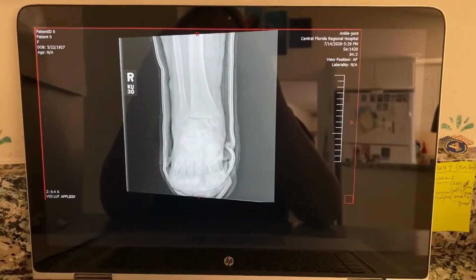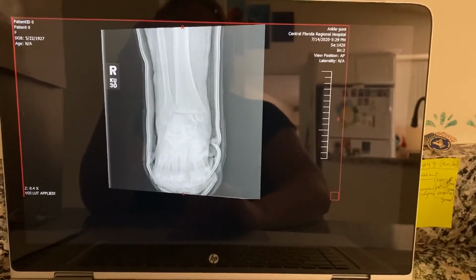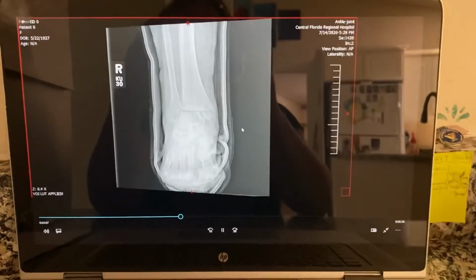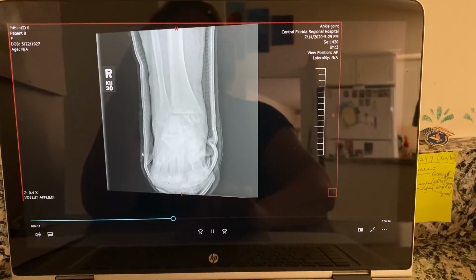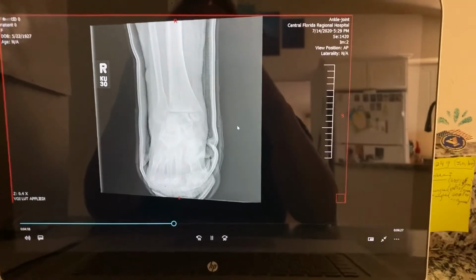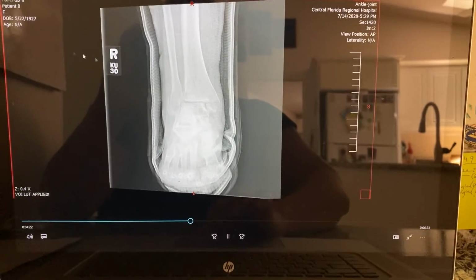For the second image, the 93-year-old patient seen for a post-reduction comparison of a trimalleolar fracture of her right ankle had no removable artifacts seen on the image, but her overlying cast is present, thus reducing the detail of the soft tissue and her bony detail. The right marker is present, and the patient's PII has been removed from the image.